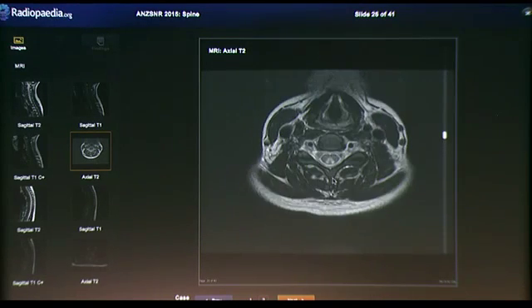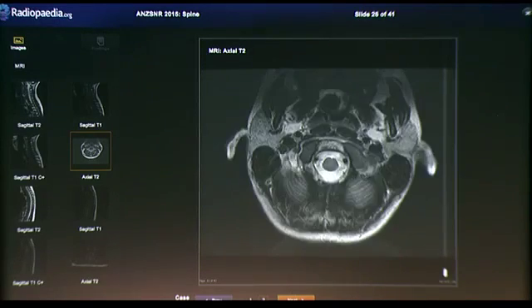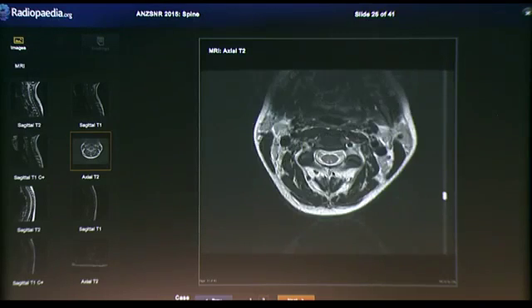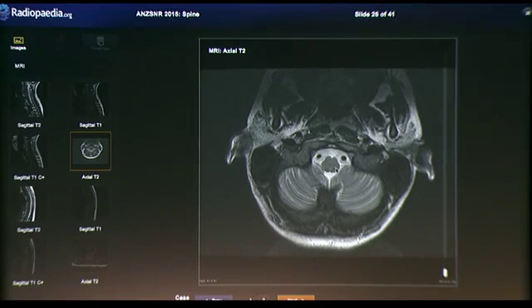The other thing just to bear in mind as a possibility would be tabes dorsalis from the syphilis infection. But this case had a low B12. And actually the other thing I should mention, this is the classic appearance for the subacute combined degeneration of the cord. In really florid cases, you can actually have slight lateral extension of the signal abnormality. And in very florid cases, sometimes the signal abnormality can extend superiorly up into the brainstem. So those sorts of findings shouldn't preclude the diagnosis.